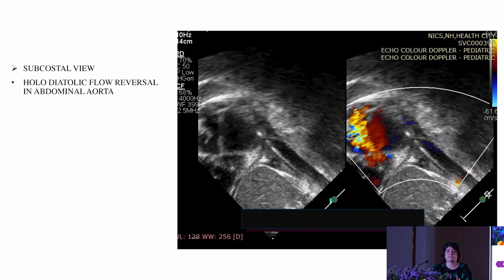This is a very interesting picture, which we got from subcostal. Until we went to subcostal, we could not see this image. Okay, you can see here that this is LV. Sorry, this is an inverted image. This is what we do in congenital heart disease. This is usually used in pediatric cardiology. People who are practicing adult echo may be seeing ventricles up, so maybe you're getting a little confused, but this is how we see the anatomical picture of the heart.